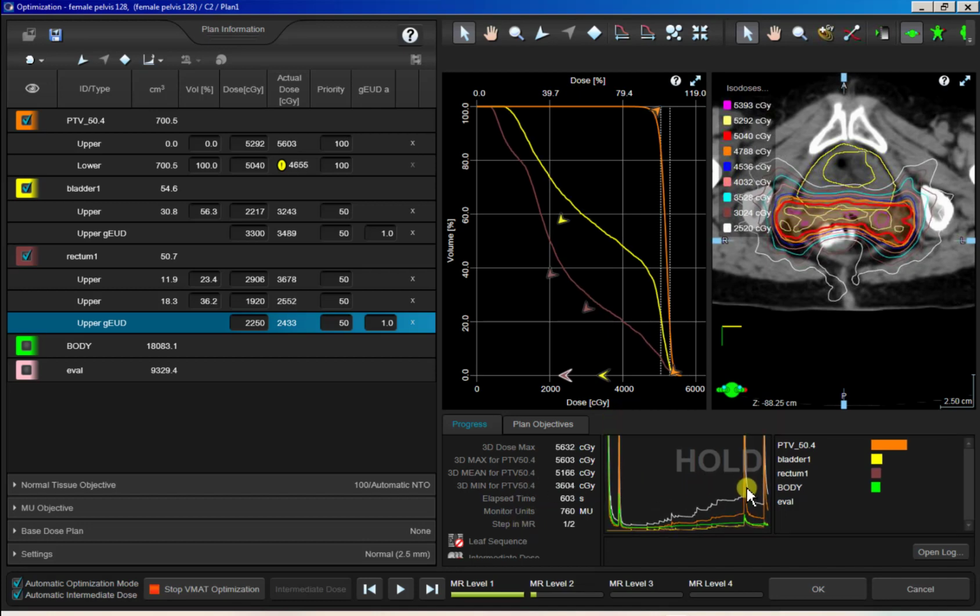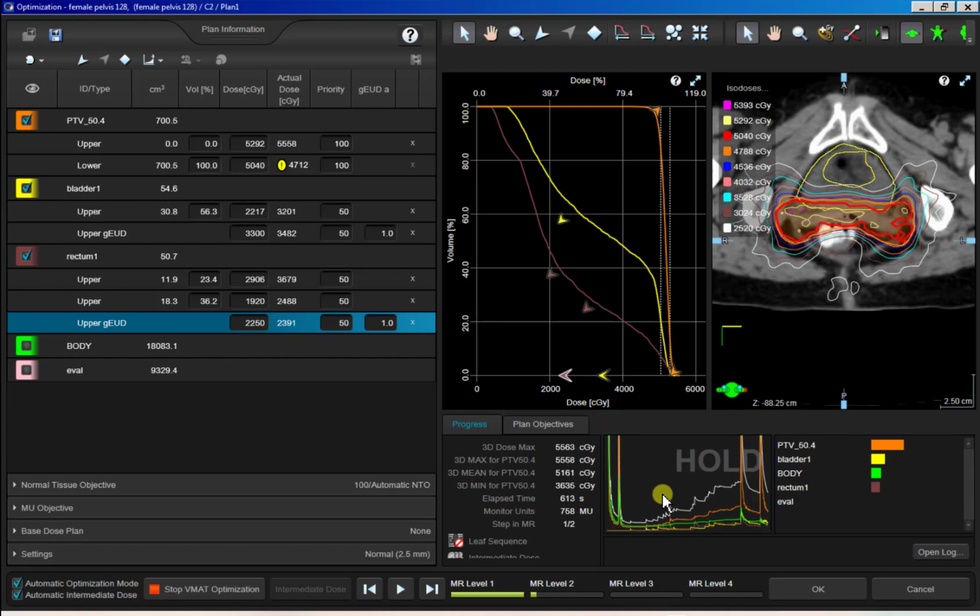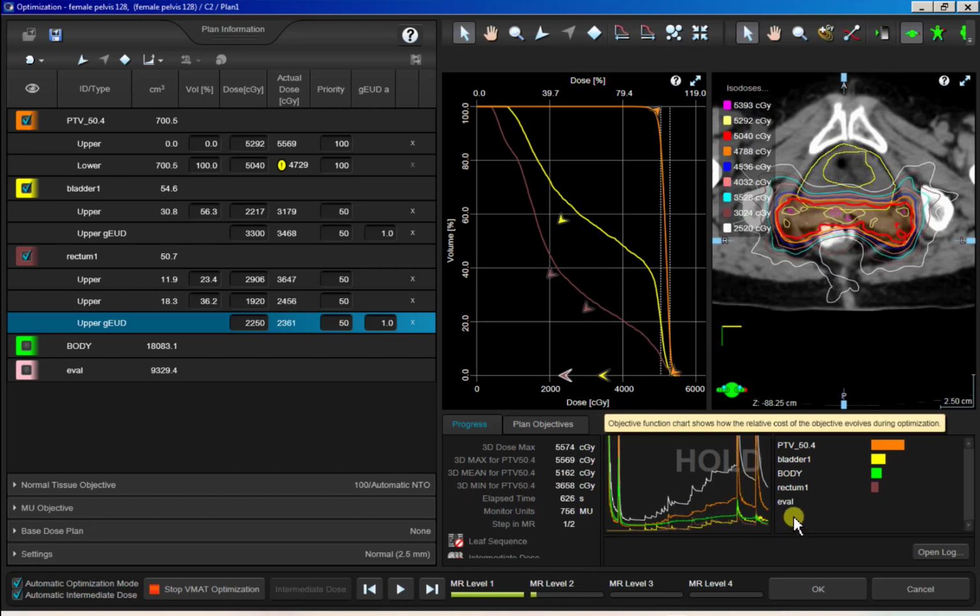And you know, pausing versus letting things play out, it's a balance between efficiency and your output, the quality of your plan. Both are important. So it's not like I sit here and let it completely level out every time for every plan. If my plan's looking great and you don't think you're going to see much improvement, I mean, you can play.